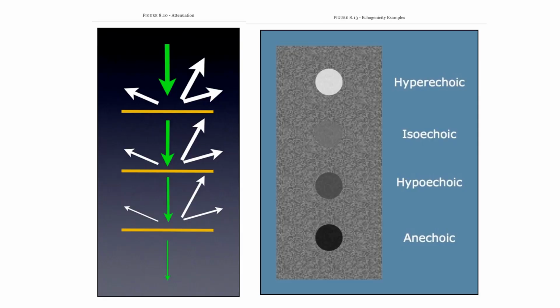By way of review, we need to remind ourselves that certain tissue densities give off certain types of ultrasound appearances, such that at the top on the right we can see this hyperechoic or bright white appearance is going to be suggested when we are insonating structures that are very dense or inflexible. So things like bone or dense connective tissue are going to be hyperechoic or bright white.